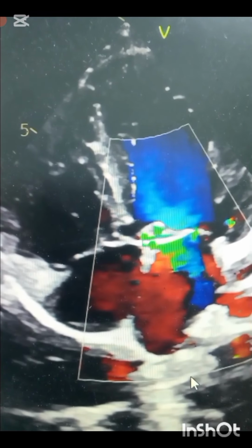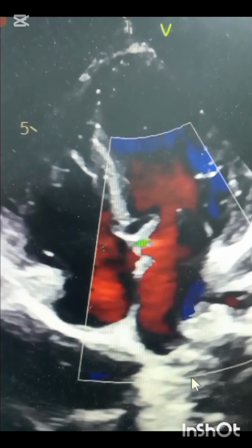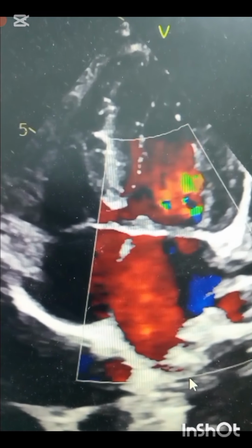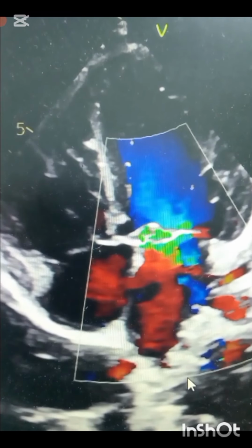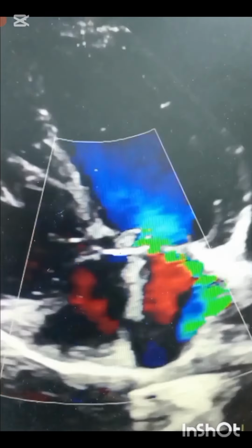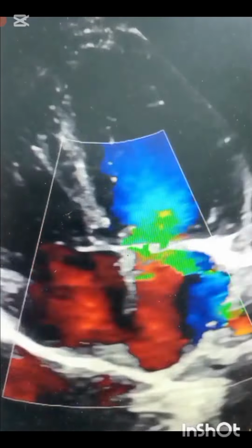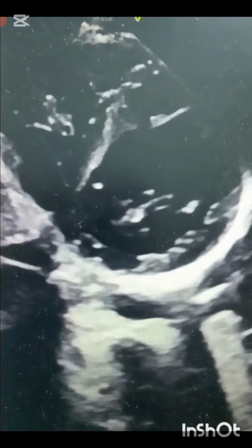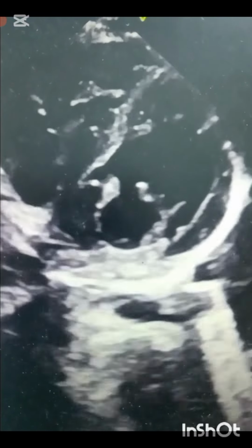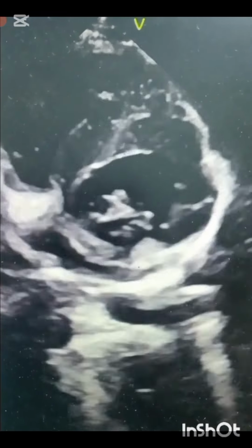To summarize, subaortic stenosis is a fixed outflow obstruction, commonly membranous or fibromuscular, and cleft mitral valve is a congenital leaflet gap causing eccentric MR. Early detection via echo can significantly impact patient outcomes, especially when these lesions coexist.